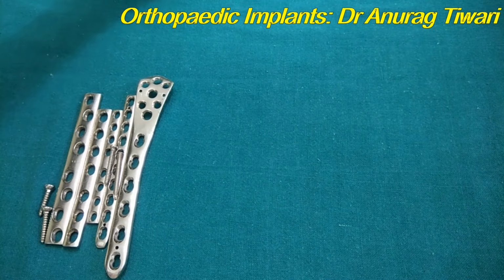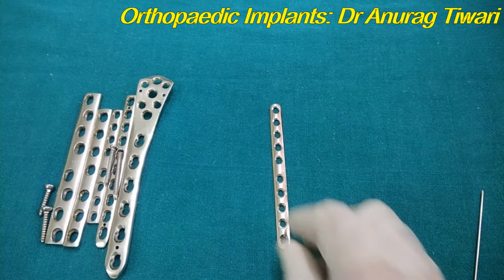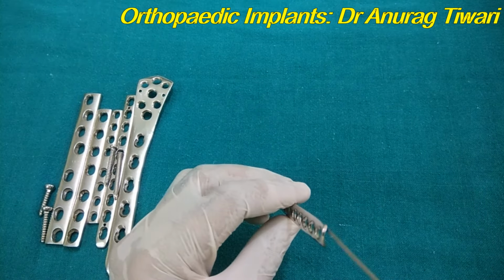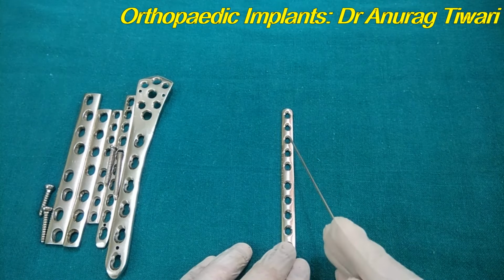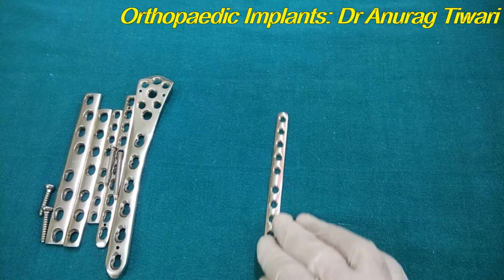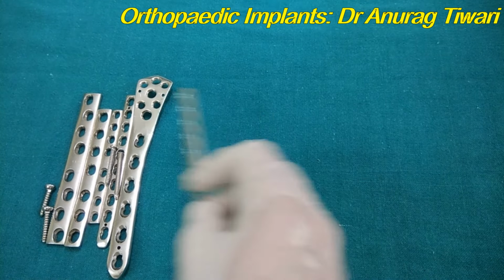Now one more plate is left, that is the 1/3 tubular plate. Now this is the 1/3 tubular plate. It is actually a semicircular type, or you can say a circular type of plate. The cross section is a circle, 1/3 of a circle, and these are holes which are non-locking. The main indication is when you go for fixation of small bones like the ulna or the fibula, you can insert this type of plate. This is the 1/3 tubular plate.